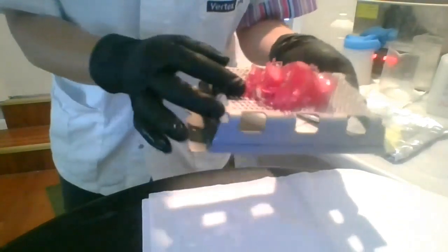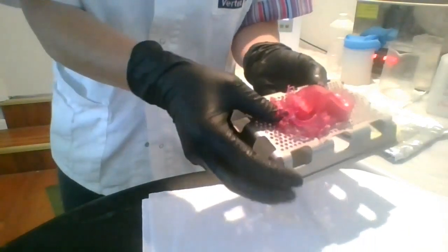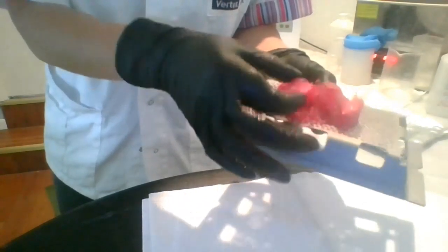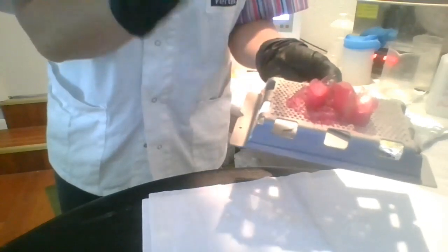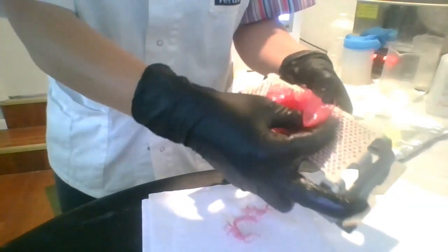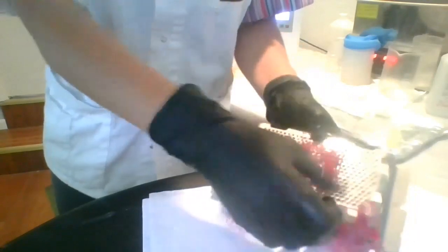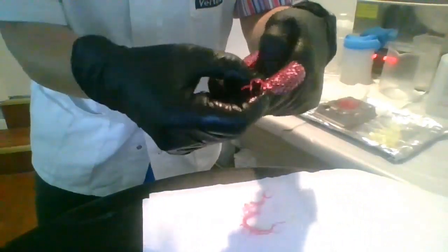So you can use either the punch tool if you'd like. And even though these are such fragile parts, you actually can just use your finger or your thumb and just pull these right off of that build platform without any risk. As long as you're gentle about it, then you don't actually have to punch them. And I prefer to do it this way. And I actually am removing all of the supports as we go. And you can see that it just comes right off. With these fine tips, it leaves literally no scarring whatsoever. This is one of my favorite things.